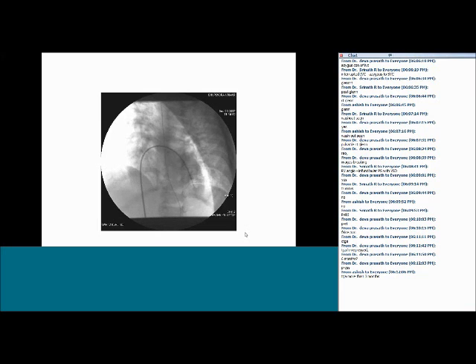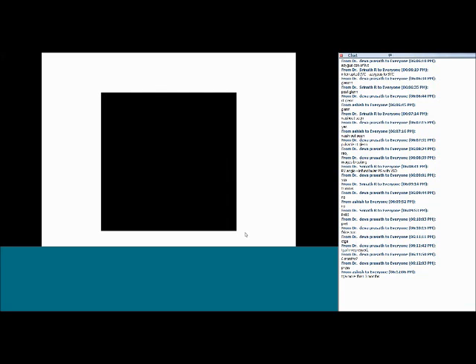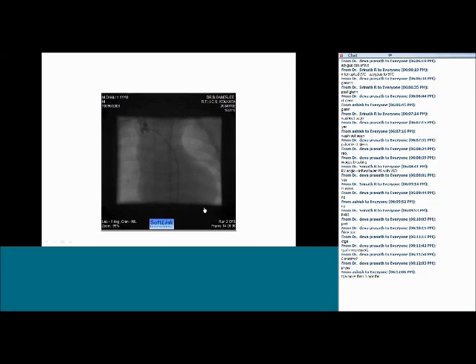All right, good. Just hold on for a second. Hold on for a second. Yeah, what is the diagnosis in this patient?